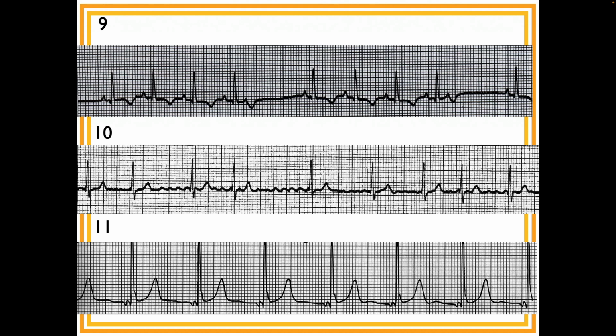On beats 1, 2, and 3, there's a P wave, like that, and then the QRS is just an R wave, and then the ST segment kind of does this, and then there's an inverted T. Does everybody see that? Okay.